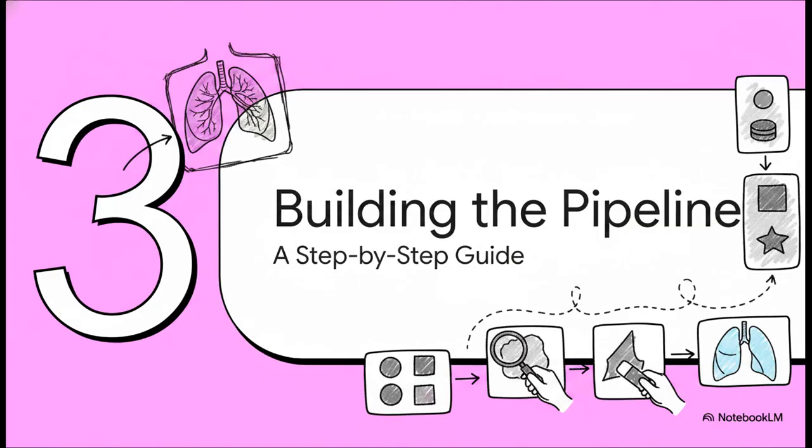Okay, so we've met our tools. Now it's time to be a little strategic and put them together in just the right order to build our complete lung extraction pipeline.